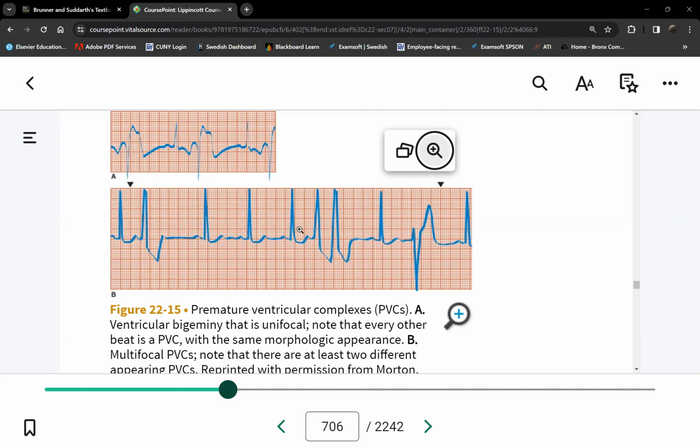And then this one, does this look like these PVCs? No, it's upside down. These PVCs are the same, right? Meaning if they're the same, that means the same source is triggering this premature impulse. You understand? So it's the same one. Whatever cells or group of cells are firing these signals, they're the same because they look the same. However, this one, does it look the same as the others? So more likely, is this the same cells firing these premature impulses? No.